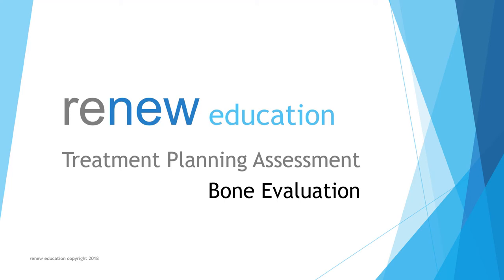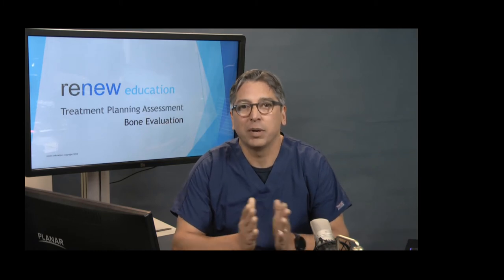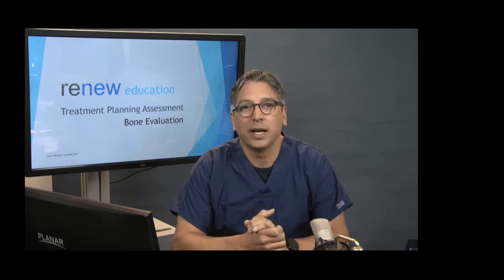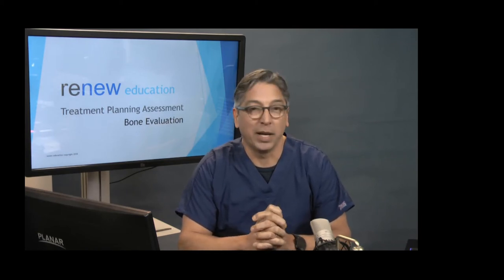Okay, you're on the second category right now. The second category looks at bone evaluation. This is something you typically cannot do at home, but if you have a CT and you're able to bring it up on your computer, maybe you follow along, learn how to use the CT software, and you can take a look at, I have pretty straightforward pictorials of what I would be looking at.